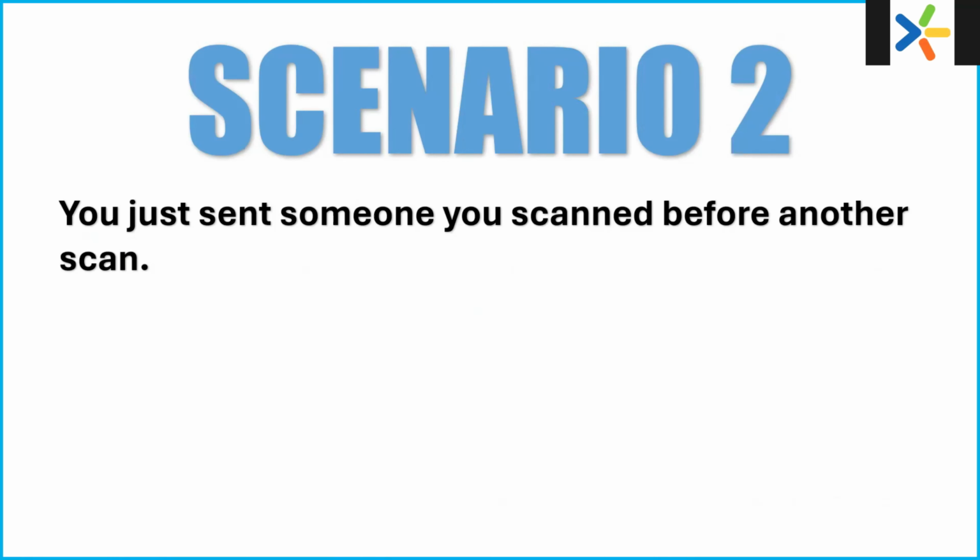Because the first time you sent them the scan, they had to set up a password and download the app and all that fun stuff. But they already did that. So do they have to do that all over again? The answer is no, they don't have to.